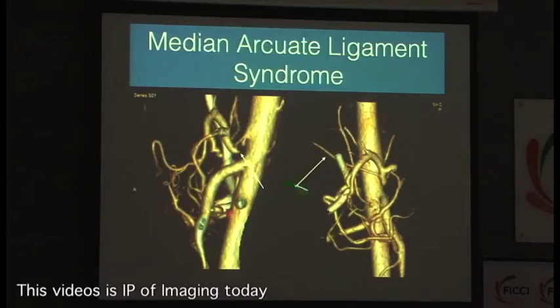The implication is, when you don't report this and the surgeon merrily goes and ties up the GDA, the hepatic artery pulsation stops. Why? Because there is no flow from the celiac. All the flow is going from the SMA through the GDA and into the celiac and the celiac branches, okay, including the hepatic artery.